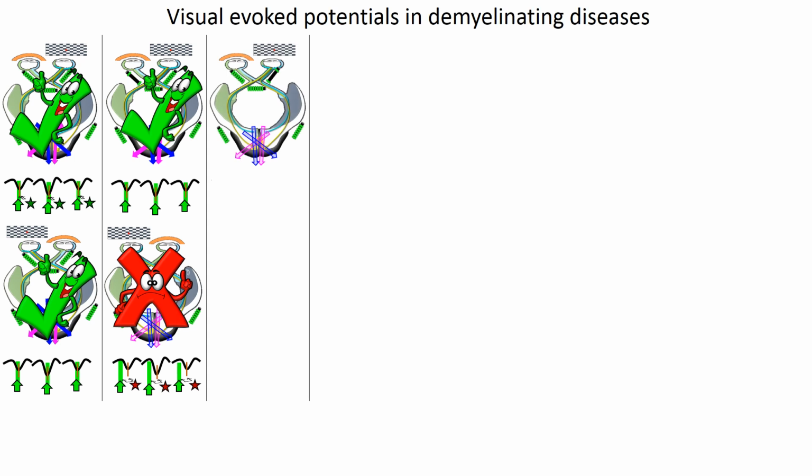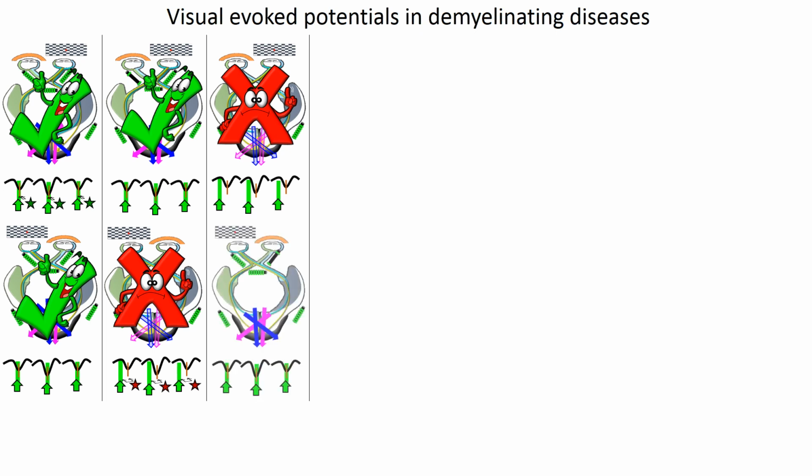In the new figure I have just introduced, the right optic nerve is represented as being significantly demyelinated. And since this is the eye being tested, all the vectors are delayed. Thus, P100s are delayed. So the right eye visual evoked potential test is abnormal. In the same situation, right optic nerve demyelination, when the left eye is tested, all vectors will occur timely, and so will all P100s. So the test would be normal.